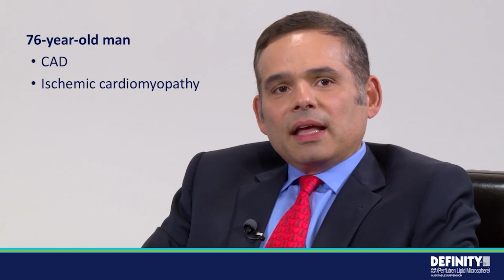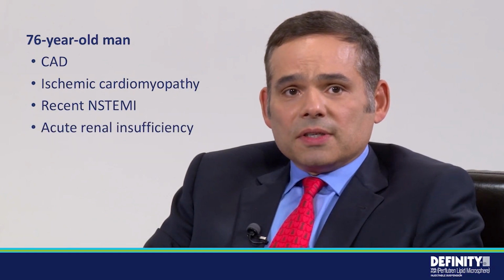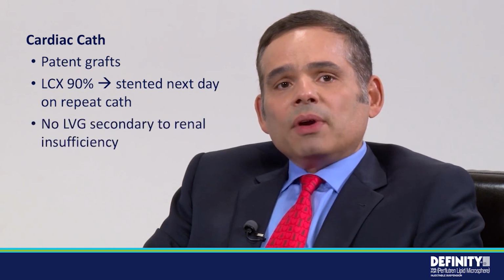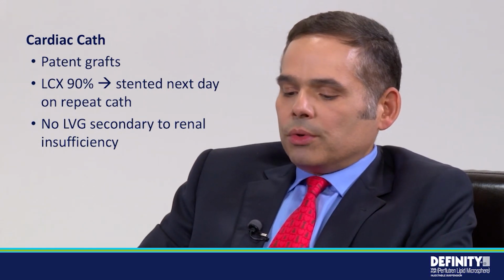Okay, our next case is a 76-year-old man with coronary artery disease and ischemic cardiomyopathy that had a recent non-ST segment elevation MI and was again transferred to our hospital for further management. Further significant history is that they were experiencing acute renal insufficiency. Cardiac cath showed patent grafts, but a native circumflex that was 90% stenosed that was eventually stented. No LV gram was done secondary to renal insufficiency, and an echo was ordered.